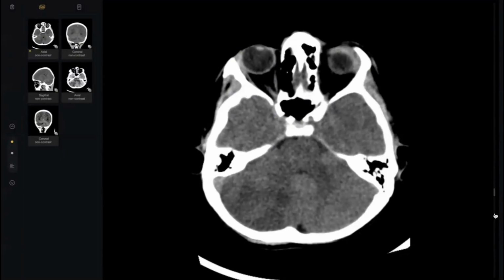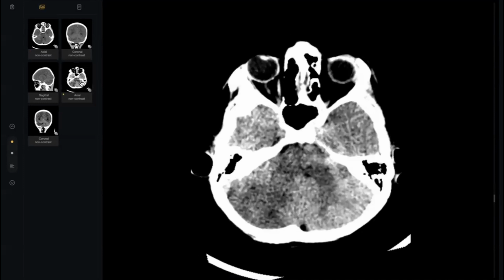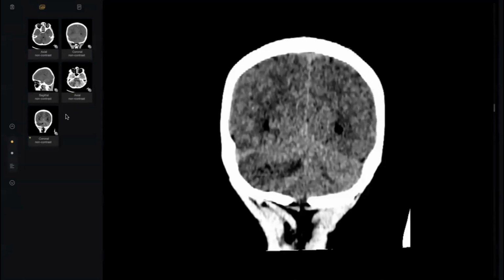I would like to see this on post-contrast images to look for any enhancement. What's your concern first before asking for anything? Tell me your concern. Patient has fever. Sir, I am thinking in the line of infection, that the patient is likely having cerebritis or focal basilar meningitis, which is involving the brain parenchyma.